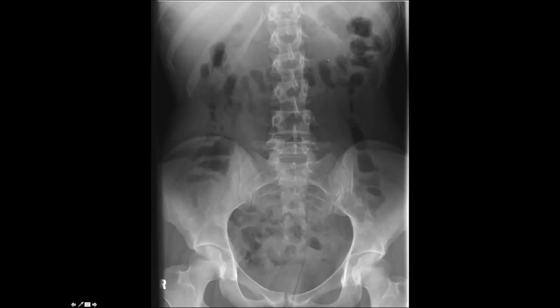In small bowel you normally don't see them, but if it's dilated you see lines all the way across, like the Slinky kids play with. You see that in small bowel obstruction, but that's a very nice haustral gas pattern there. That's correct. So that's the large bowel.